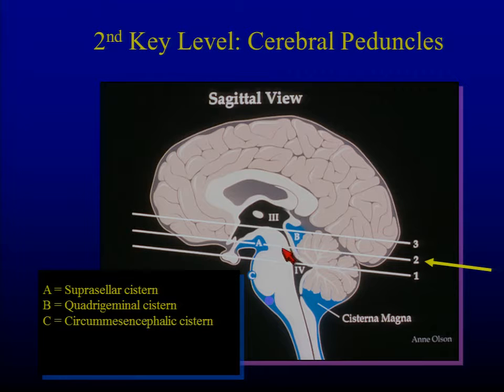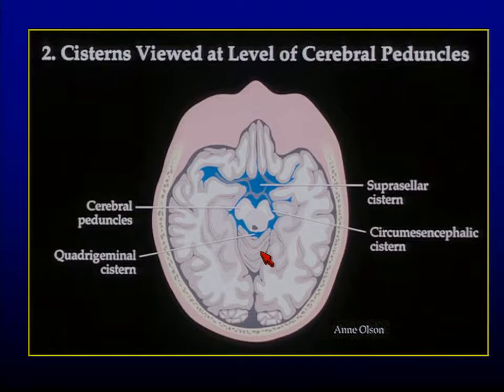We'll get a little bit of the brainstem, but we're into what's really important, which is my suprasellar cistern, which is the second. So remember, I said there's 4 cisterns I care about as an emergency physician. The suprasellar cistern is where the circle of Willis lives. And that's really, really important when I'm trying to decide if a patient has a subarachnoid hemorrhage, because about 80% of aneurysmal subarachnoid hemorrhage happens somewhere in this circle of Willis. So about 80% of the time that I'm going to find it, this is where I'm looking.